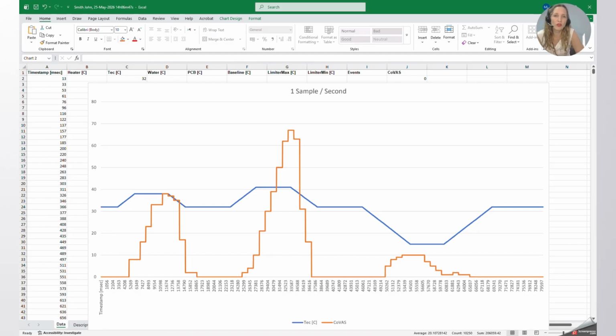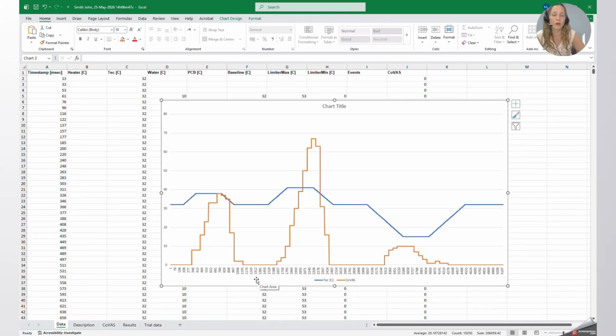And really, based on your protocol, if you're going to collect pain data from your patient for over an hour, you may want to run a little pilot and see that your computer memory and your Excel will be able to handle it. So this is mostly dependent on the working memory in your computer and in your Excel to be able to handle such a large amount of data.